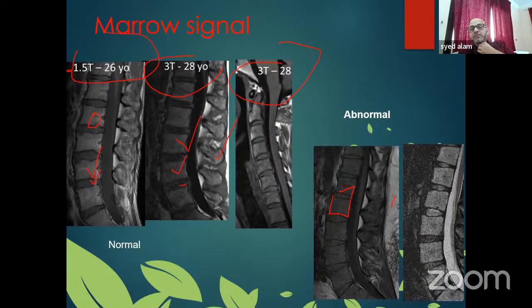We should also know that in anybody who is a smoker, the marrow can be abnormal. Someone who is 200 kilos plus can have abnormal marrow. On chemotherapy, there are so many causes, both physiological and pathological conditions. But it is better to mention it, to save ourselves. So I just mention that T1 shows dark marrow signal, please correlate with the lab findings. Lab findings, like leukocytosis, no leukocytosis, anemia. This can cause the abnormal marrow.